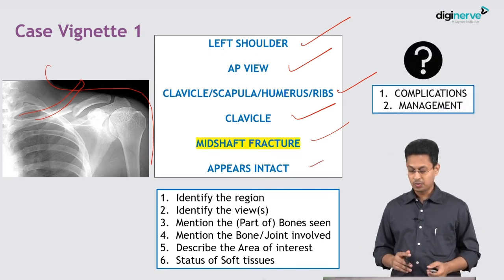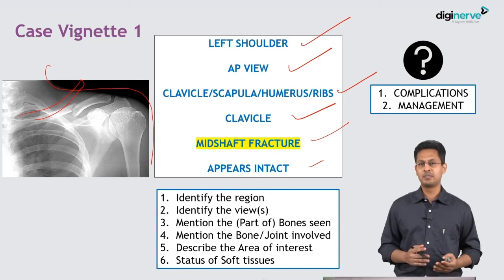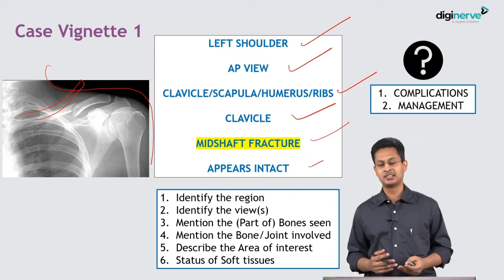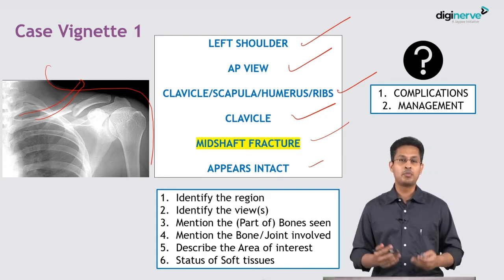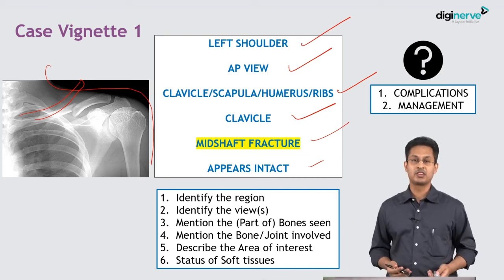Now the potential questions that might be asked with this X-ray. The examiner might want to know the common complications or the mechanism of injury.